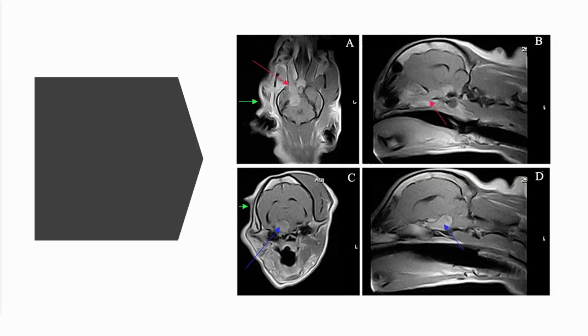Here's another example of a trigeminal nerve root tumour, really just to show the anatomy as well. So you can see the nerve root coming forward and going towards the eye here, and here in the alar canal, and the large mass here, and here. And it's when this mass becomes a large size that the dog will start to have more obvious clinical signs. Often when it's just a nerve root tumour, you just see this asymmetrical muscle loss. When it gets to this large mass, then you can get other signs such as vestibular signs, facial nerve signs as well sometimes.